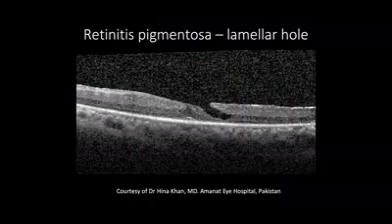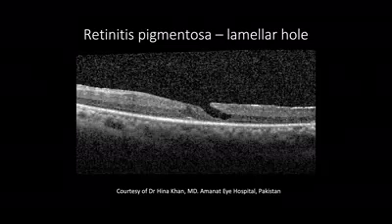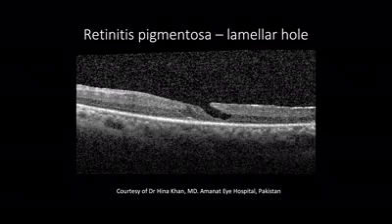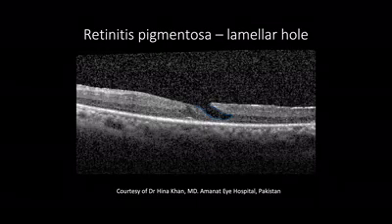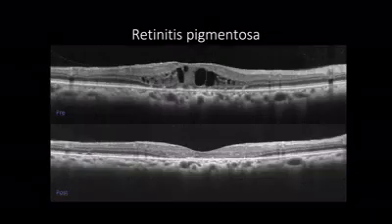OCT is very useful to monitor cystoid macular edema progression, as in this case, cysts ruptured the inner retinal walls, causing lamellar hole due to loss of Müller cells support. On the other hand, OCT can reveal post-treatment efficacy.